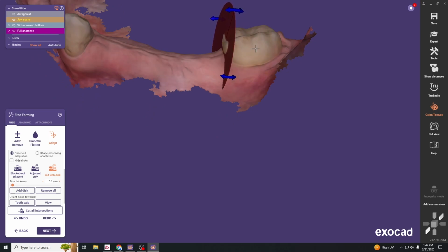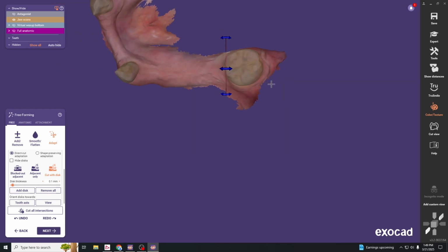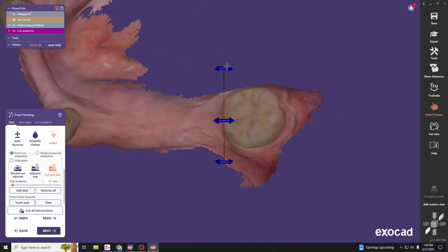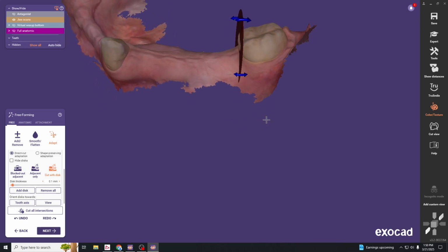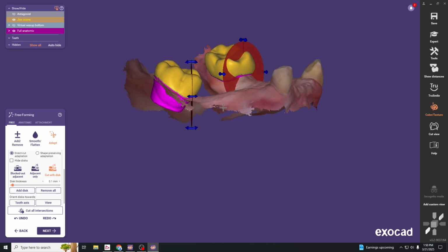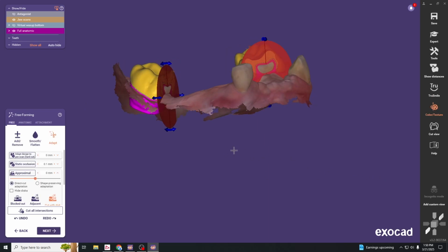when you're doing this. And then you can also use these little arrows here to change the angulation. It still keeps the two parallel to the path of insertion, but this makes the tooth reduction against the interproximal surface a little bit more conservative when you've got it kind of perpendicular or parallel to the interproximal surface there. Okay. So if you're happy with that, I'm going to turn on the teeth just so you can visualize what's going to happen here. When I hit the proximal button here, you're going to see that the wax up gets sliced exactly to that disc there. Okay.